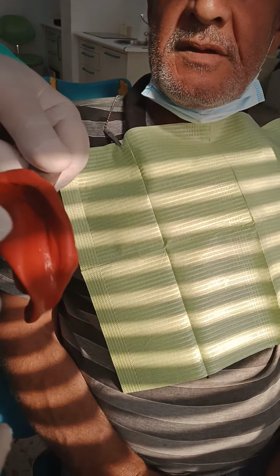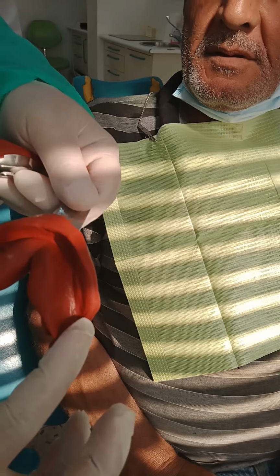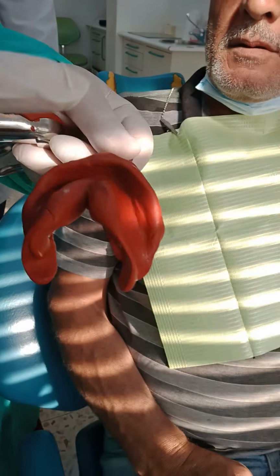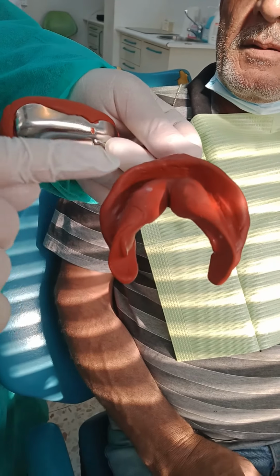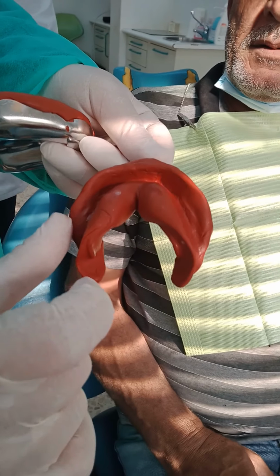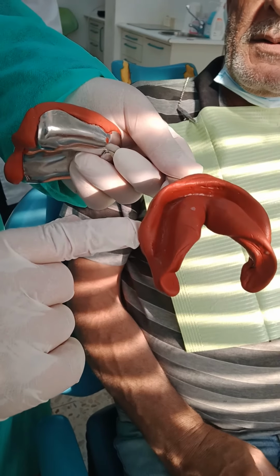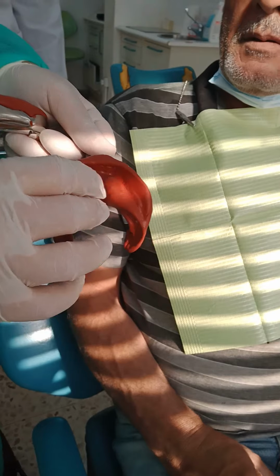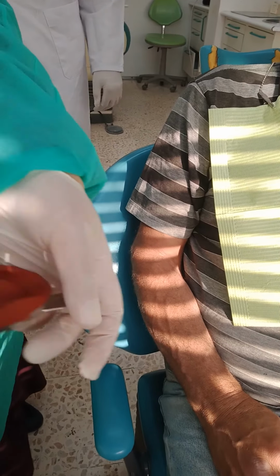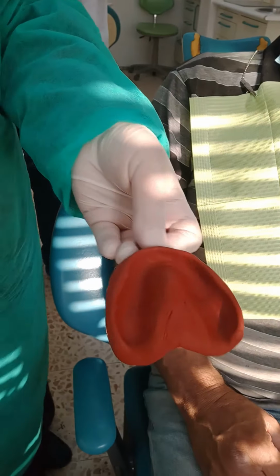But here, the anatomy is telling me that this impression is correct, and the actual measurement is telling me it's correct. So once more, the deepest labial areas are around the premolars, then they become shallow, while the lingual pouch is deeper than this side. So the anatomy is telling me that the impressions are correct, other than the other features you've seen in other videos. Here I'm concentrating on the anatomy.